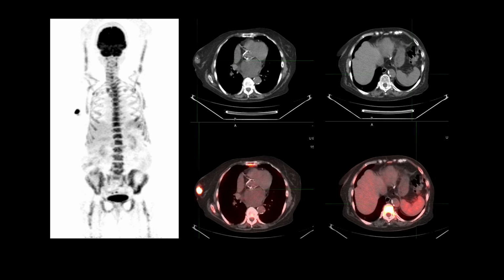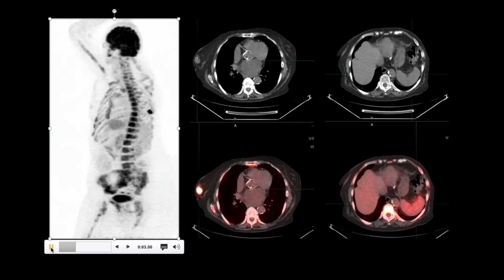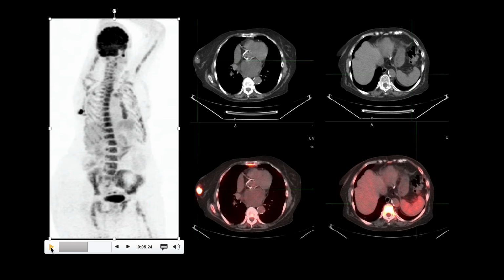This is our third patient, a young female who presented with a mass in the right breast. She underwent a mammogram and an ultrasound guided biopsy, and the biopsy showed lymphoma. And so she underwent a whole body FDG PET CT scan to stage the lymphoma. On this rotating image, we find that there is a focus of intense uptake seen in the right breast. This focus is seen here as a soft tissue density mass with a hyperdensity, which is a clip post biopsy, and there is focal hypermetabolism.